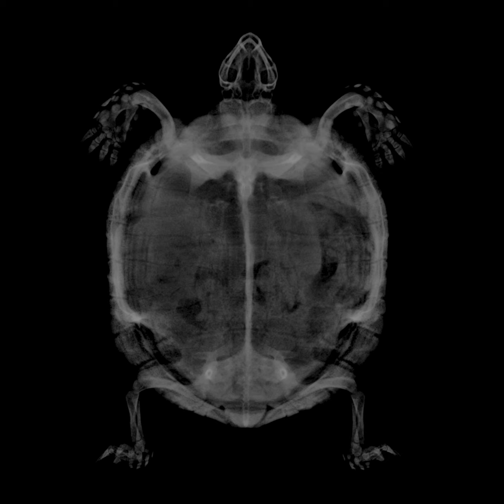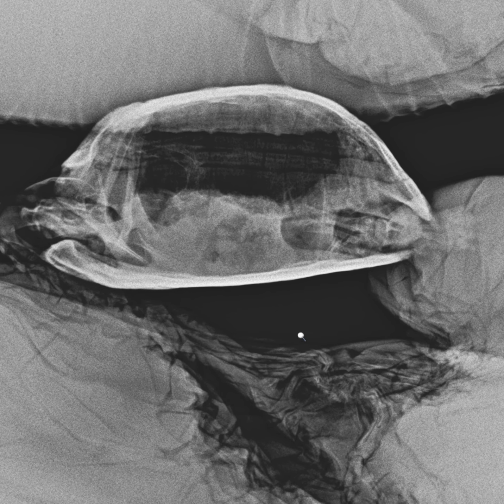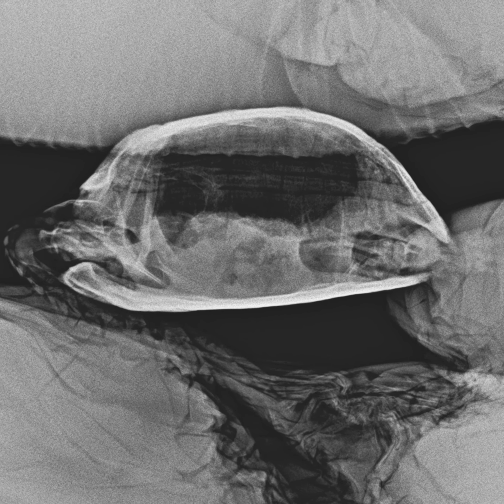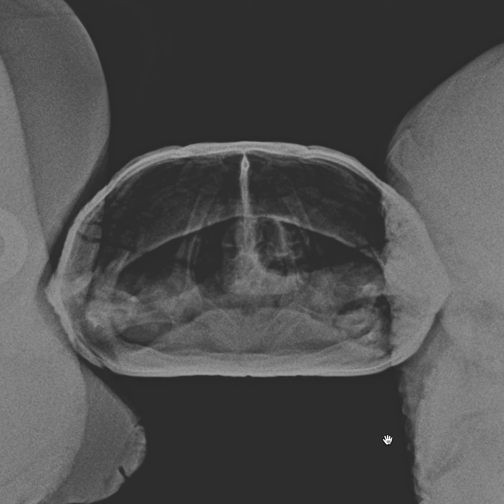Today's example is a 1-year-old female entire tortoise with open mouth breathing for the last 4 hours. We have a dorsoventral view, a lateral view, and a craniocaudal view.